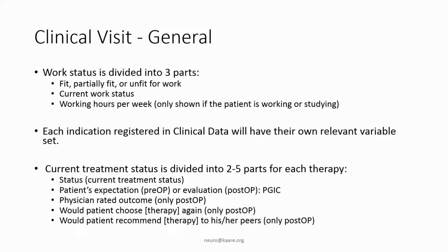First, there is the status, and then second of all, there is the patient's expectation if it is before the start of a treatment, or the patient's evaluation if it is a follow-up visit in the patient global impression of change. If the patient is currently treated with a specific therapy, the physician can rate the outcome. The patient can note whether they would choose to have this therapy again, knowing what they know now, and also if the patient would recommend this therapy to his or her peers. There are a few other fields that can be registered in clinical visit, and I will demonstrate this now.